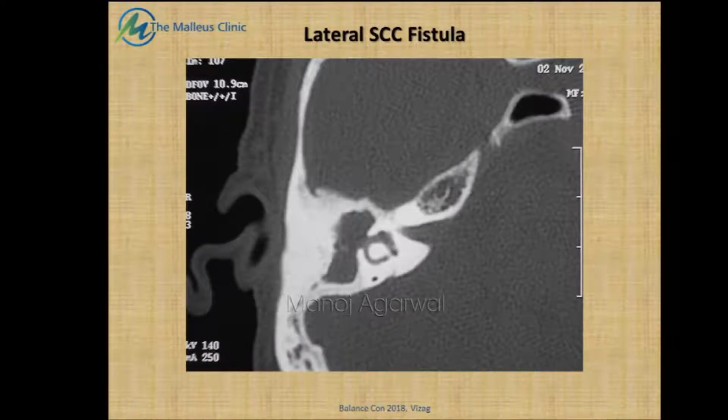Why? Now, if your patient has the clinical picture that you saw, and starts complaining of dizziness and sensorineural hearing loss, this is one very common pathology that you expect. That's the vestibule, that's the lateral semicircular canal, and as we can see, the labyrinthine bone on the lateral aspect of the lateral semicircular canal is eroded. Thereby, this is a frank lateral semicircular canal fistula, easily diagnosed. Not much of rocket science there.